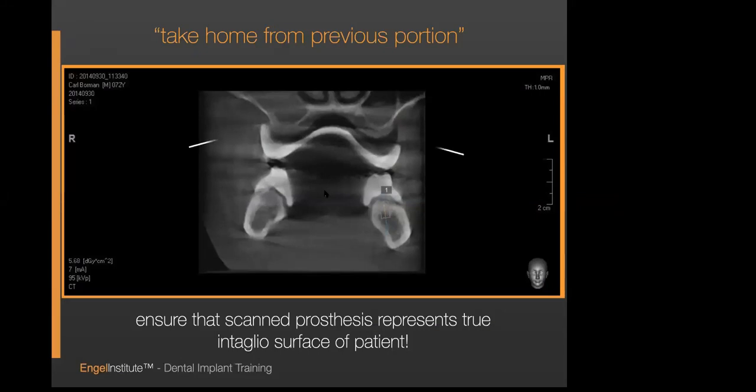And if you look here, you can see a clear issue with the patient in the CBCT and the actual bite that's created. So you see a lot of dark space on the patient's left side, as you see here. On your right side of the screen it would be, but the patient's left side. You can also see on the patient's right side, your left side, that it looks almost like the denture is hitting the bone.